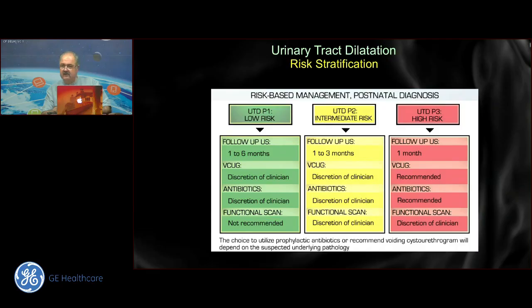Bilateral renomegaly with increased echoes, we've discussed this extensively. The larger the kidney, the greater the chance of autosomal recessive, and with the rest of the group, we normally find normal sized kidneys. How to assess the renal parenchyma thickness in the kidney? I just love this question.